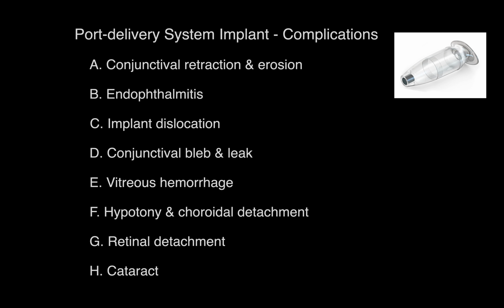Dear colleagues, in this video we are going to talk about the complications of the Port Delivery System implant or PDS. Let's get started. The first complication is conjunctival retraction, which is recession of the conjunctiva in the area of previous peritomy with or without implant flange exposure.